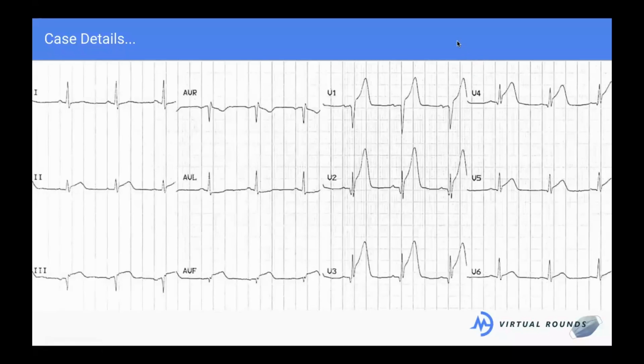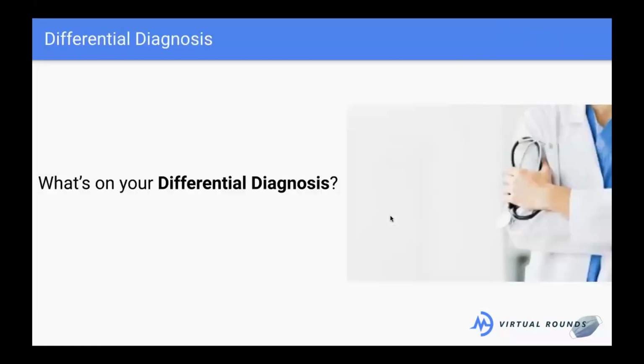Here's his EKG, and we are going to go through this. And hopefully by the end of this talk, you'll have a better sense of how to make sense of all these lines. But basically, here's his EKG. We're going to come back to it at the end of the talk, and I hope that this will all make a little more sense, but here it is for now.